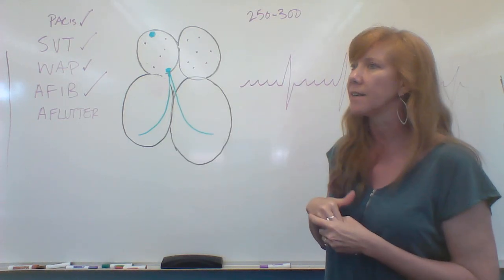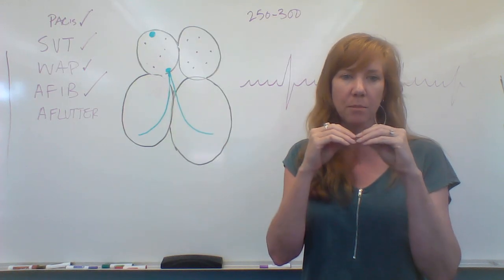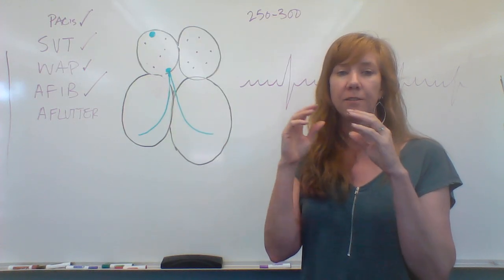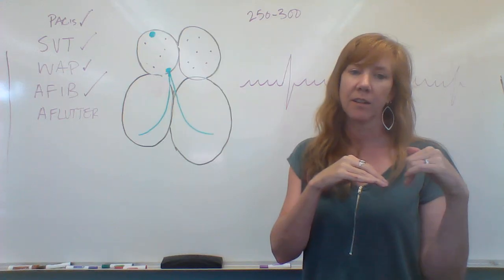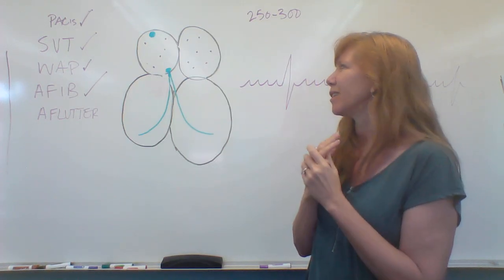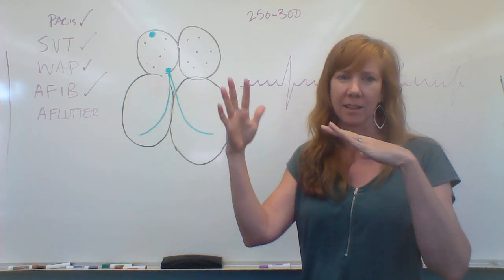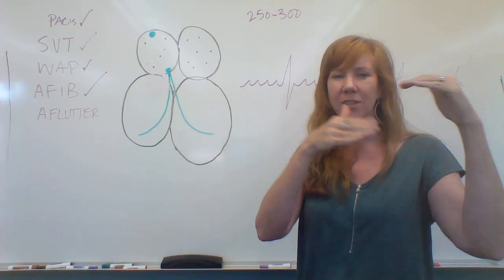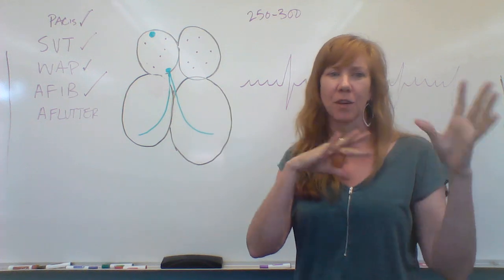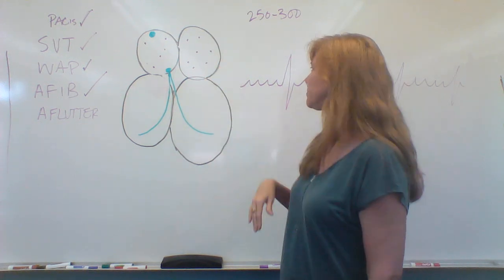So some classes, like if you take a dysrhythmia certification class, they'll even have one in the middle that you learn called fib flutter. And some classes are like, there's no such thing as fib flutter. But there really kind of is. Like there's a middle one where it starts looking really hinky and unevenly spaced, and you can't tell if it's fib or flutter. It doesn't matter. They all have the same problem.